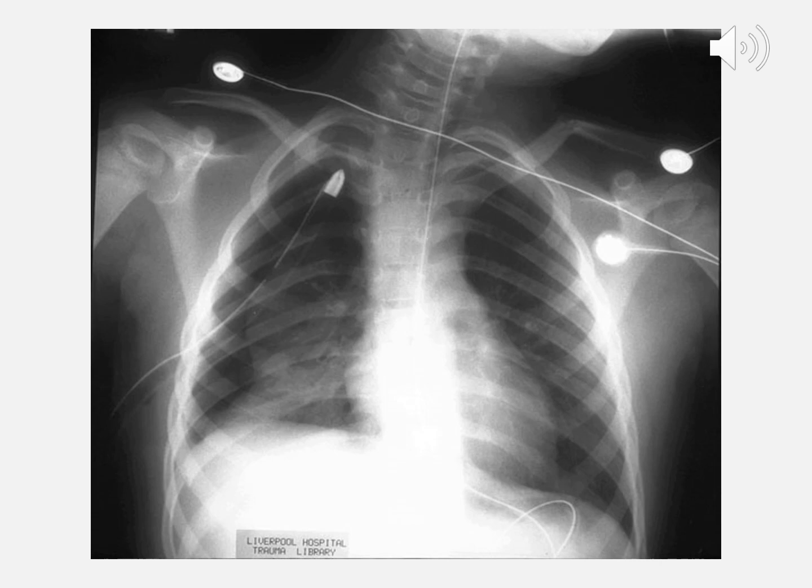He's got a chest tube in place. You can see it up there around the tip of it, around the second, third rib. Right lung looks okay. There's that, that's an NG tube. It doesn't look like an ET tube going down his trachea. It looks like it's in the esophagus. I don't know. That's really a hard one for me. But anyway, this is a right-sided pneumothorax with a chest tube, a clavicle fracture, and a teenager who's rotated towards the left.